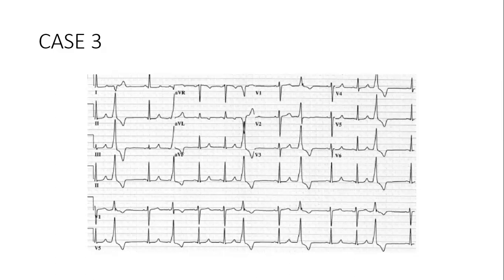Let's look. Are there P waves? Look at lead, what's that lead? Lead 1. Are there P waves? There are P waves in lead 1.